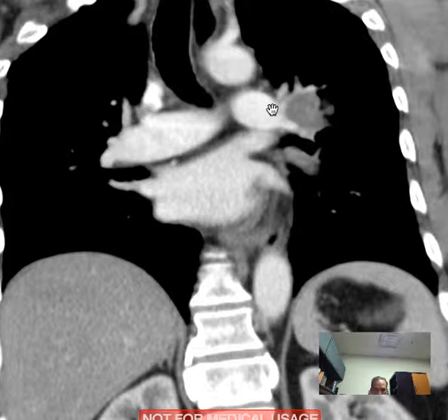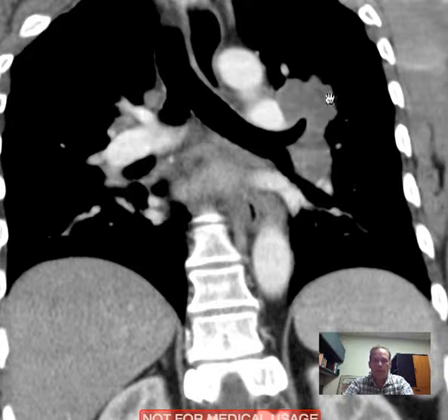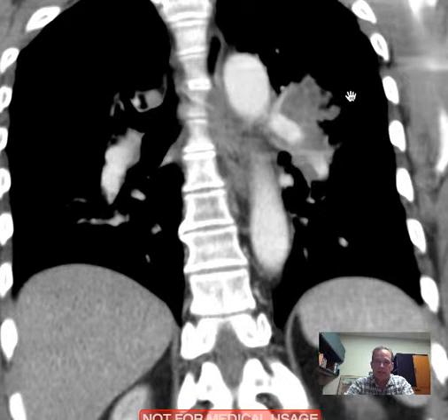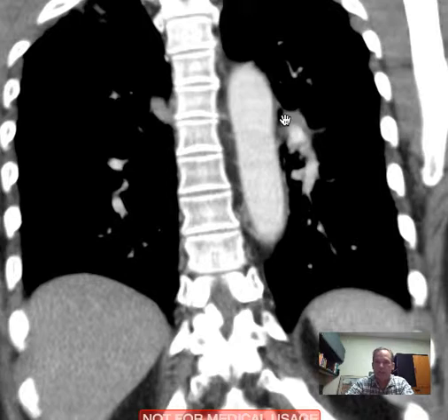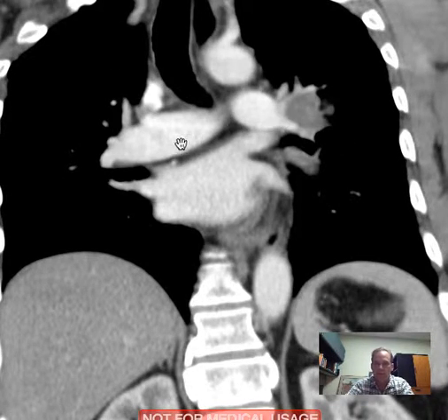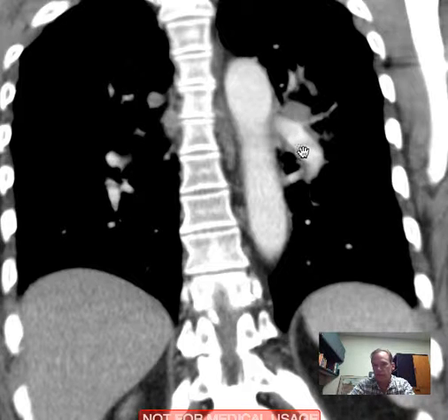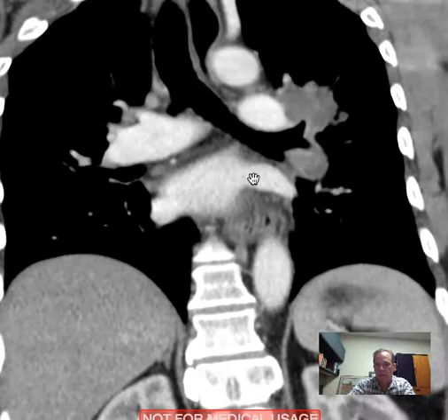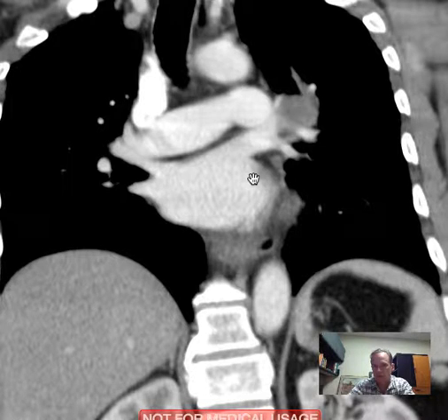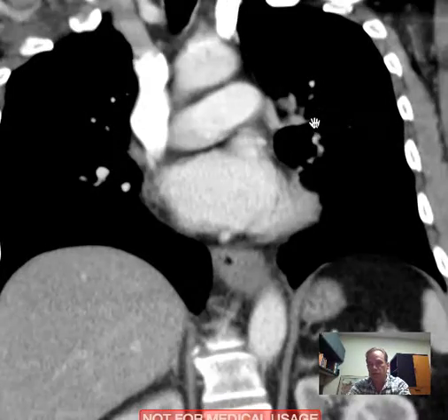And we can see that here by going posteriorly and seeing that this vessel here has dived back posteriorly, whereas on the right it goes more directly down. Here it's going down on the right and it's going back on the left. This, of course, is the aorta. This will start to get you a little familiarity with the anatomy of the mediastinum. So here you have a mass, and this is bronchogenic carcinoma.